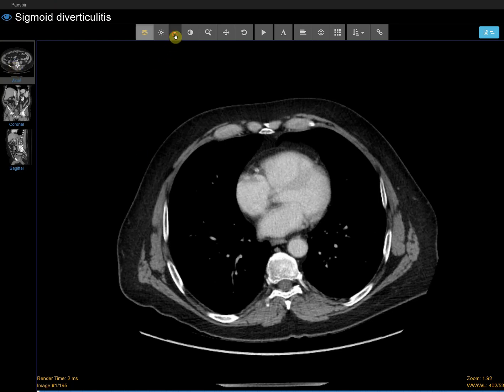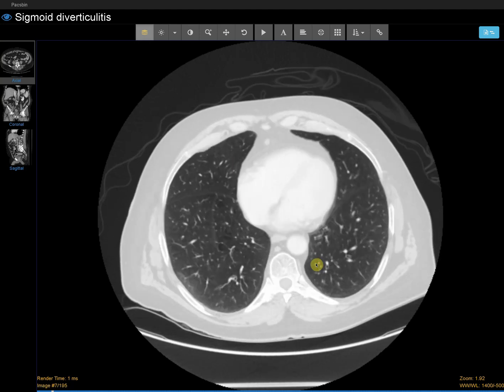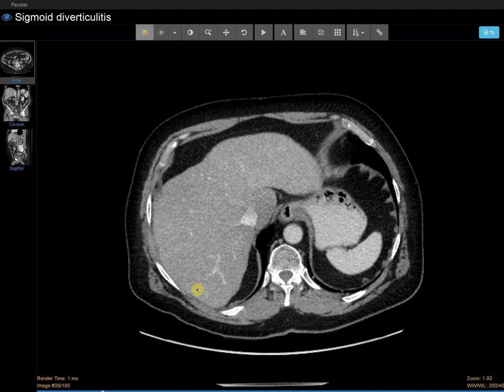Like I told before, the way I start is that I first start at a lung window, look at the lung bases quickly, make sure there's no big pneumonia, pleural effusion, or pneumothorax, and then go to soft tissue window down. On the first pass, I'm just taking 15-20 seconds, getting a quick view of every organ once. So, liver looks okay.